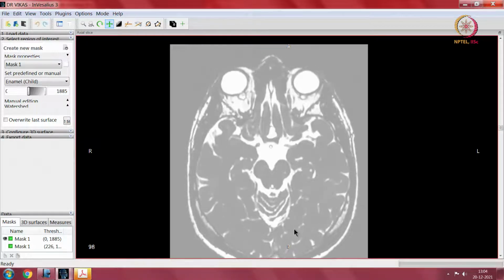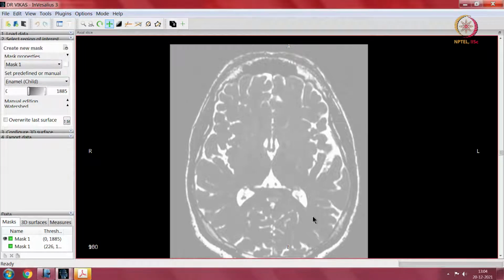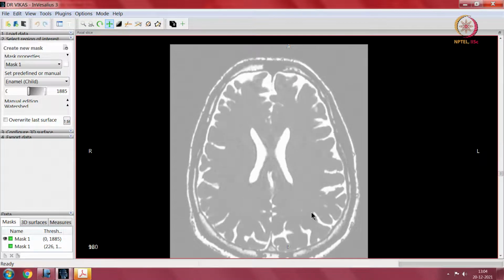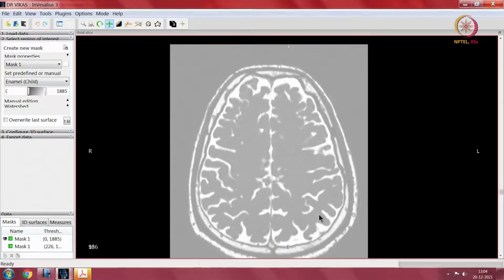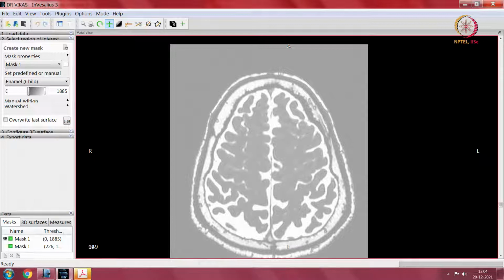So, that is a set of gyri and sulci which you can see. Please do note again that I have not described all the sulci which I described on my 3D model here, because there are only that much of inferences which you can get from each sectional imaging.